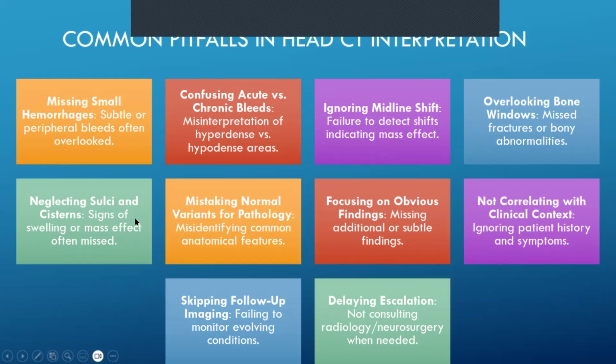You may not, for instance, be able to pick up a base of skull fracture. That's very subtle. Even radiologists do struggle with that sometimes. But it's something that at least you should be able to pick up a facial fracture. You should be able to pick up a skull fracture at least, all right? So, don't neglect the sulci and the cisterns, looking for swelling, mass effect, things like that.